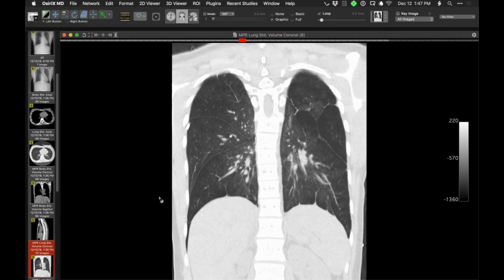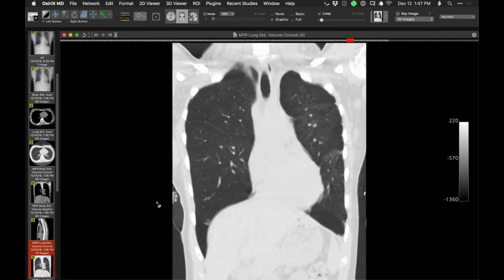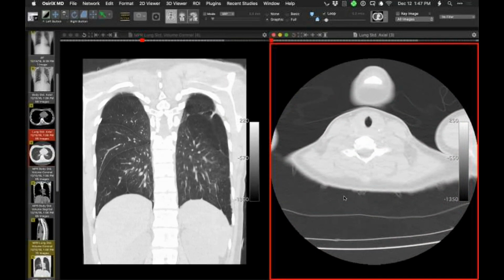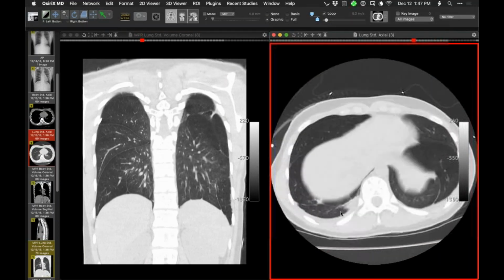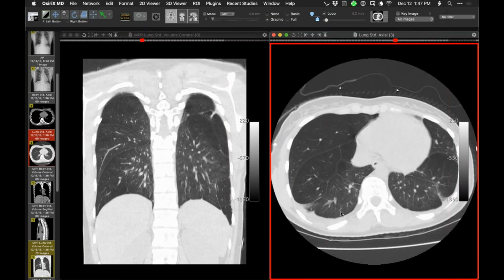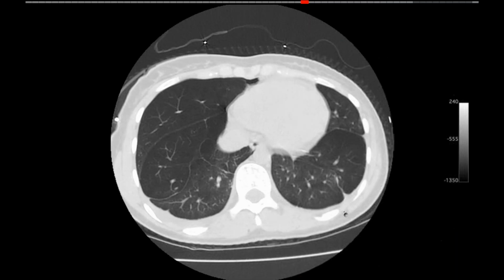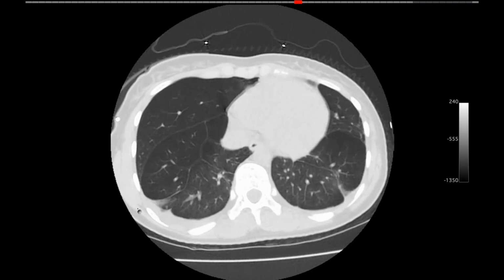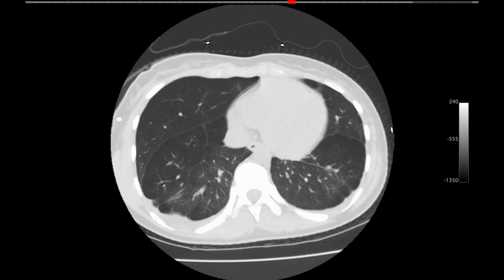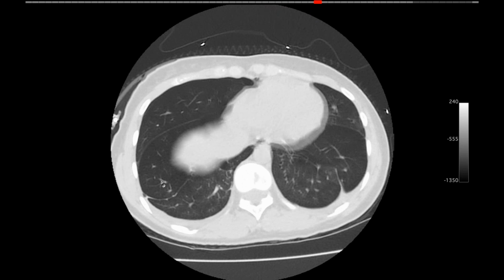That's a nice example. It's interesting though. It looks like there's some volume loss in the lower lobes too, and it may just be that the upper lobes are hyperinflated. If you look on the axials, the fissures are retracted quite a bit. Yeah. They may be underdeveloped too. They could just be small. Yeah, it could be a combination of simple underdevelopment of lung tissue. She probably has pleural effusion, pleural thickening from her recent pneumothorax and tube.